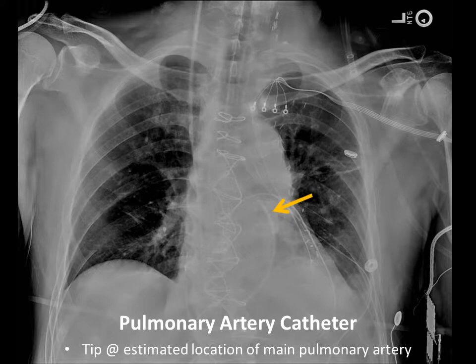It can cause an infarct of the lung tissue if it's too far, or if the balloon is inflated too long, you may see consolidation, which indicates infarct or ischemia of the lung. In that case, you want to alert the clinician, and the line should be pulled back.